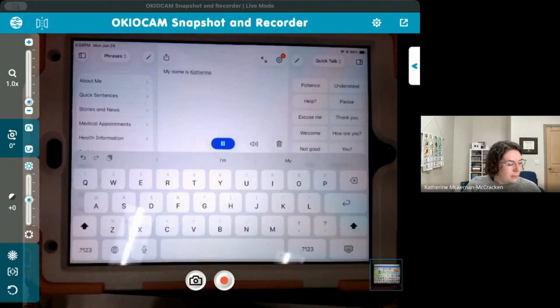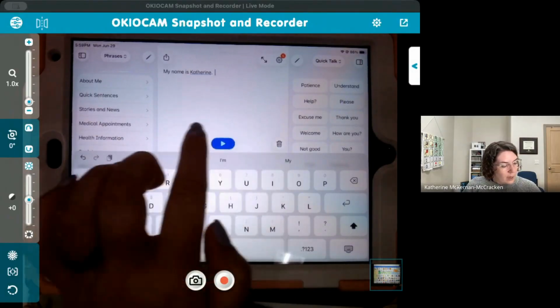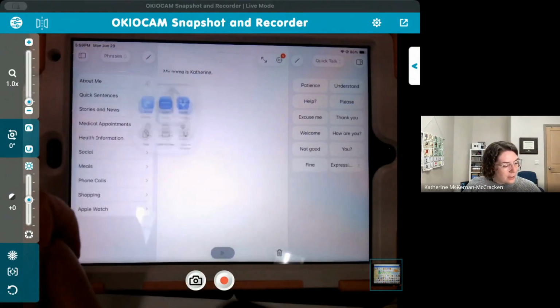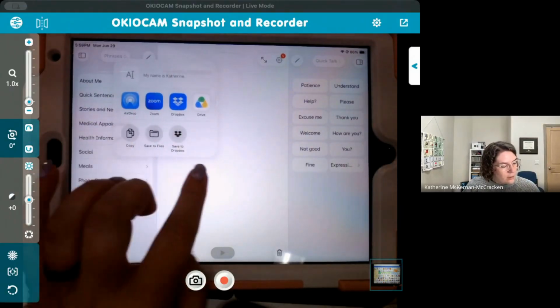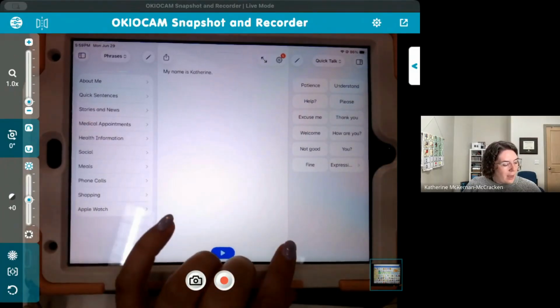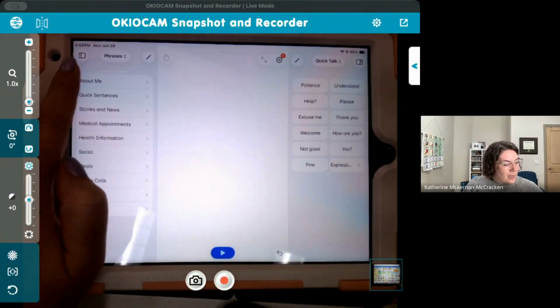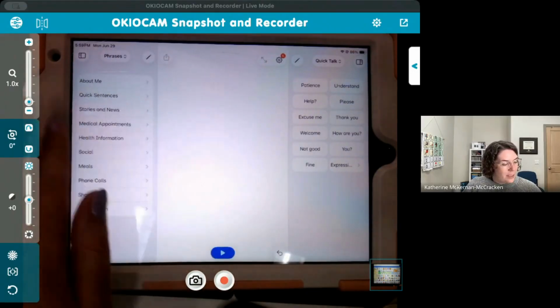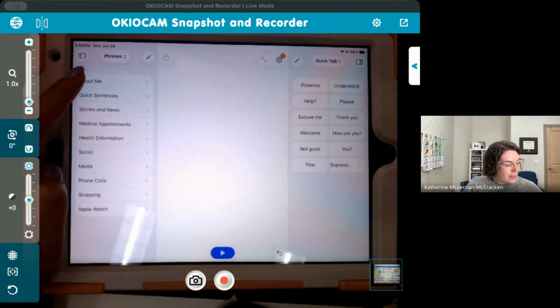I can understand everything you say, but I use this program to talk because my speech is hard to understand. Also send text messages or emails from the text you've typed in your keypad, word pad, I mean, and it makes it easy to add and edit things that you've typed into saved phrases.